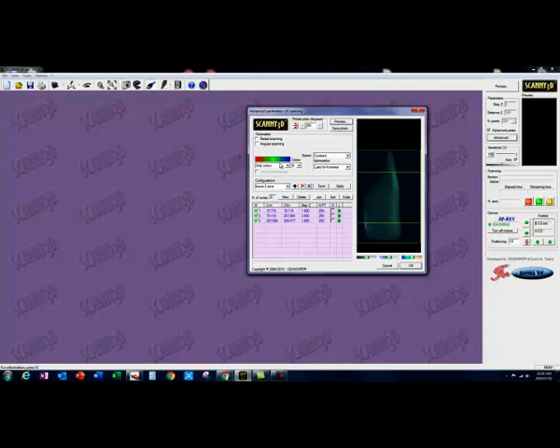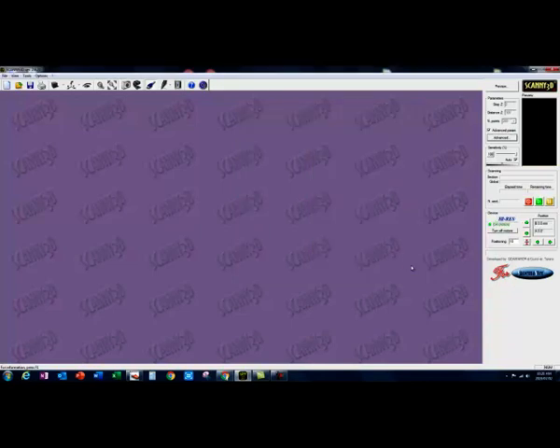We've also got a setting here which, because in our previous scan we only wanted photographs, we said color only. The options are geometry and color, only color, color and spray. The 2 that you guys are going to use are geometry and color. You're going to use geometry and color most often, and only color sometimes. So I'm going to set this for geometry and color, so it's going to acquire the 3D geometry, and it's going to take 6 photographs to wrap as a texture. Once this is okay, I'll say okay.